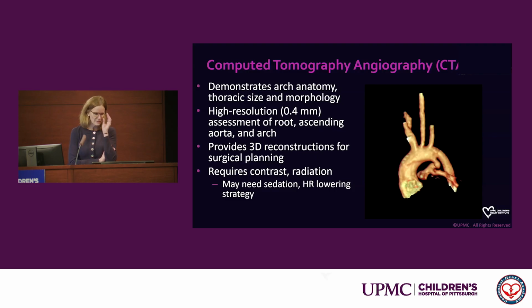CT exquisitely demonstrates the arch anatomy, the thoracic aortic size and morphology. It's extremely high resolution. Really any part of the aortic arch is accessible by CT. Not many limitations there at all. And then we can create these 3D reconstructions, which can help both with decision making about what treatment a patient needs, and then if surgery is selected as the treatment, can help plan the operation.